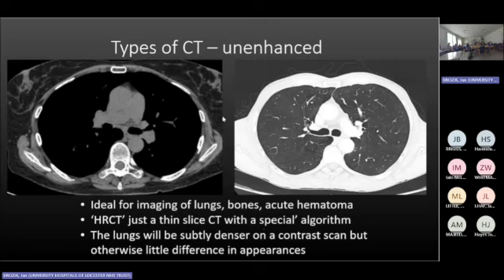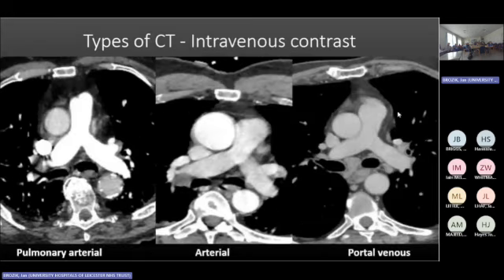When we switch it to the lung window, we can beautifully assess the lungs. So we know that the patient doesn't have emphysema, just a little bit of emphysema. They don't have pulmonary edema or other conditions. But the assessment of the mediastinum or bones is really limited in this window.